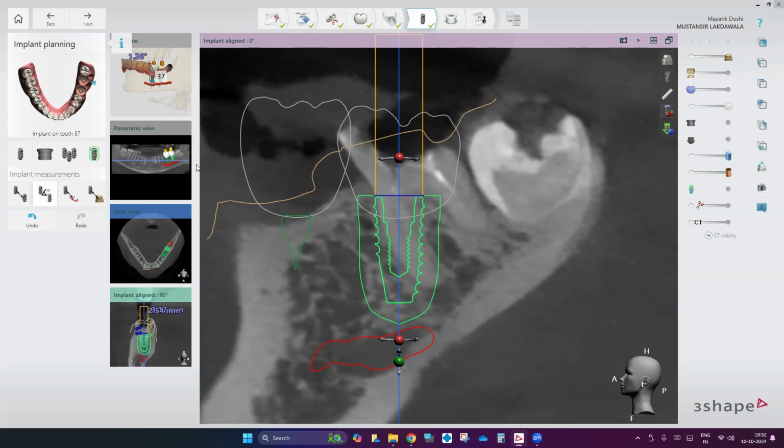So, for example, if you look at this implant's position, where the guided procedure wins over here is that to create this path is extremely difficult after doing this extraction. I hope you guys agree that when you remove this entire molar, to make your drill pass through and only pierce this much and stop is very, very difficult. But when you're doing guided, the surgeon is able to do this flawlessly. And because the entire engagement is going to come from this one-third of the bone, the implant is going to receive extremely high stability.